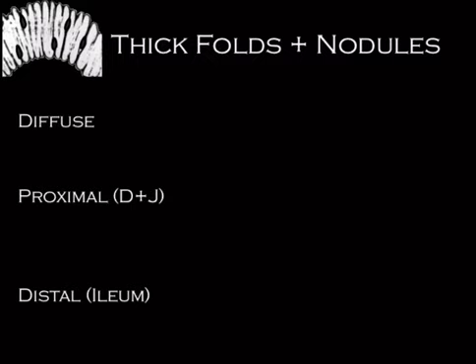Now, lymphangiectasia is something where it's a zebra. Basically, it's a protein-losing enteropathy. You've got blockage of your lymphatic drainage in your small bowel. You end up leaking albumin. They could tell you the patient has pulmonary edema. They could show you a picture of lower extremity soft tissue edema. And that's a diffuse process.